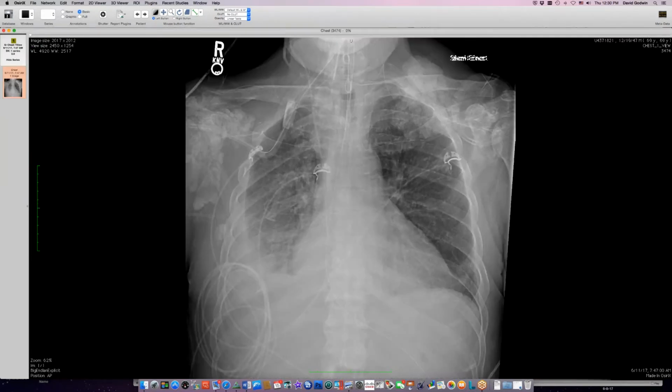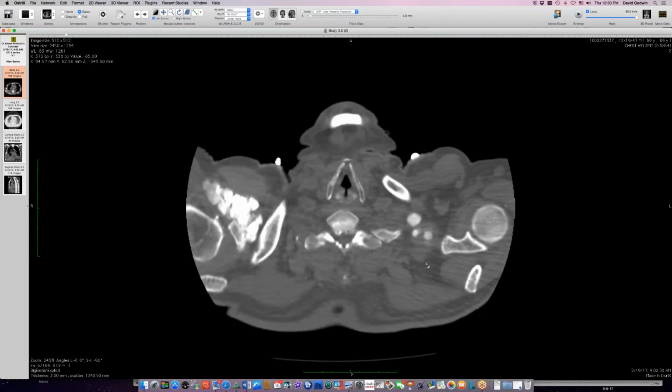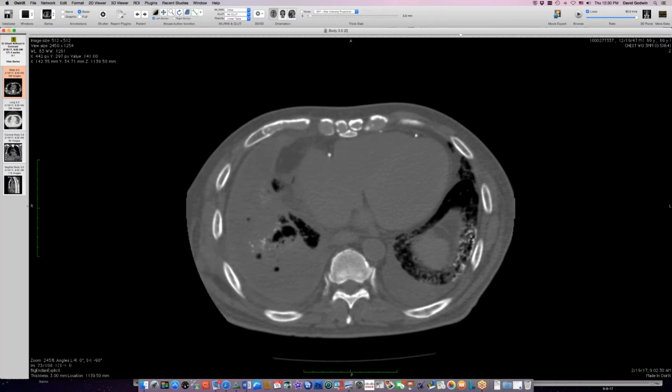Okay. And my third case is this florid example of tumoral calcinosis, this dramatic calcification around both shoulders in a person with chronic renal failure and hemodialysis for a long time. I think I have a CT on him that also shows all of these calcium collections in the soft tissues around the shoulders, medial to the shoulders. The other thing that he has is some very interesting DPO-like lung calcification way out at the periphery and the bases. It looks like confluent DPO, and here it's more speckled on the other side.